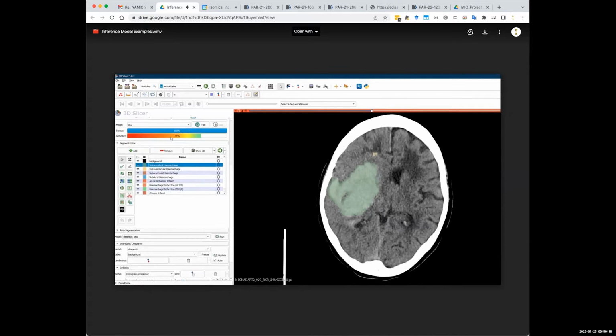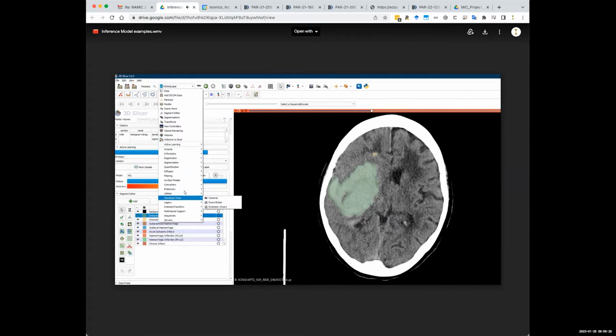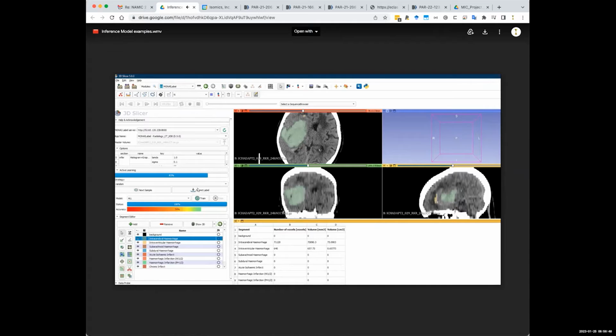And as you can see, we can get the volume from the region of interest. Now that we have that there, you can see that it's calculated that as a 73 mil intracerebral hemorrhage, which is, I can tell you, going to be very, very accurate. It's going to be within a few mils of what we would call the gold standard, which is basically manual labeling.